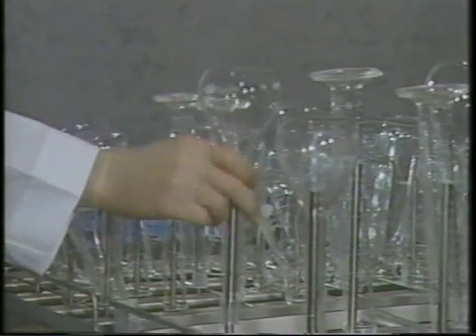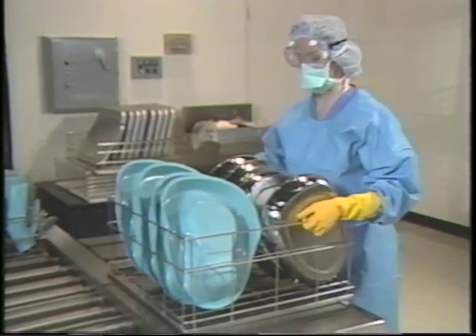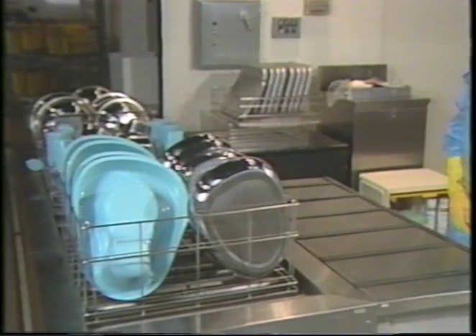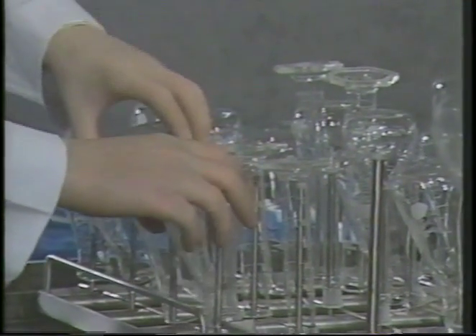Remember, in all circumstances, complete water coverage of the load takes precedence over mechanical action. Manual or mechanical washing cannot clean surfaces they cannot contact. Flanged or curved items such as glassware should be placed with their opening down on individual spindles. Metal objects such as basins should not be allowed to trap water or be stacked in an effort to conserve space. Edges of devices should not be touching to facilitate free access of the cleaning solution.